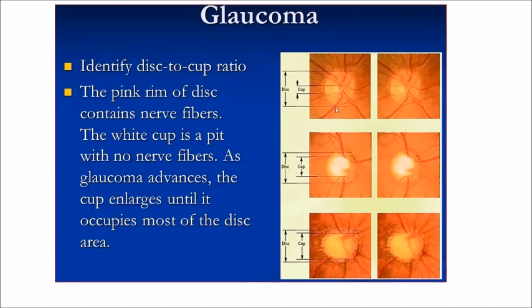Glaucomatous optic atrophy. So just to compare, Dr. Farial, from the picture above and below, the vessels are coming from the center. This is normal. And there is a very small white area, this is the optic cup. So it is becoming bigger and bigger. So this is glaucoma. Chronic open angle glaucoma.